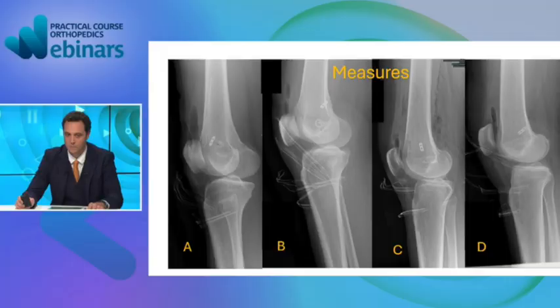I don't like the C myself, because you see that there is an inclination of the X-ray compared to the femur anyway. But I would say that you can have a fair evaluation of the slope, probably the medial one, and we're going to discuss that after, with the C. Do you agree, or do you not agree with that?